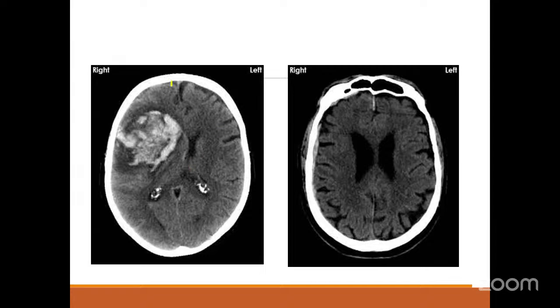We often hear it. So ventricles which have to be in the midline are crossing to the opposite side. This is a sign of mass effect, of a lesion exerting mass effect onto the rest of the brain parenchyma. We measure it by looking at something called midline shift. Apart from the herniations which I have spoken about, it causes mass effect.